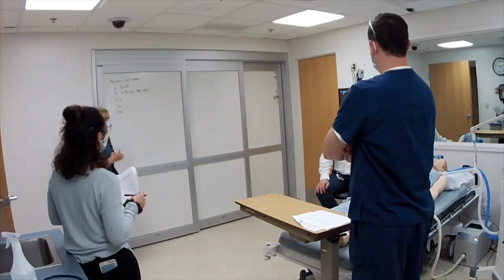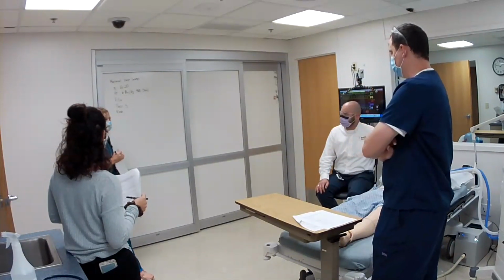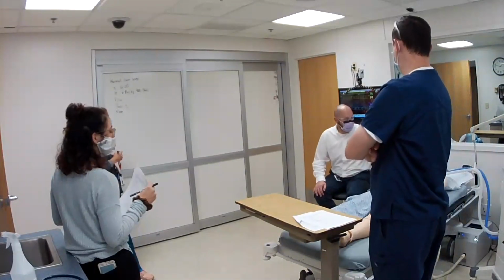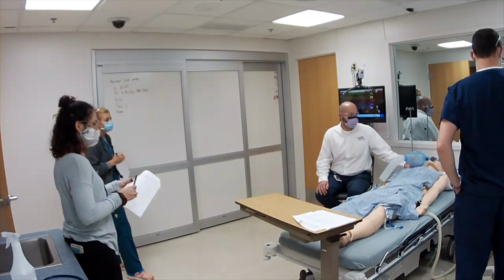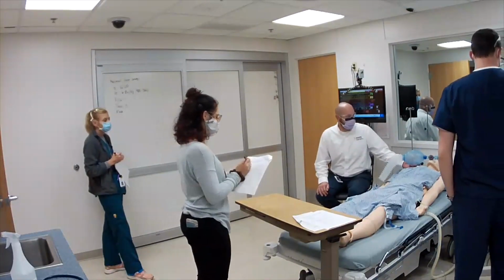All right, so we're going to have to pick a mode, and then there'll be maybe something else that goes with that, right? I think we pretty well have everything figured out there. Okay. So, Janice, your big moment here. Let's hit that top left corner where it says volume control. Let's open up the mode screen. All right, so let's talk about each of these in turn.